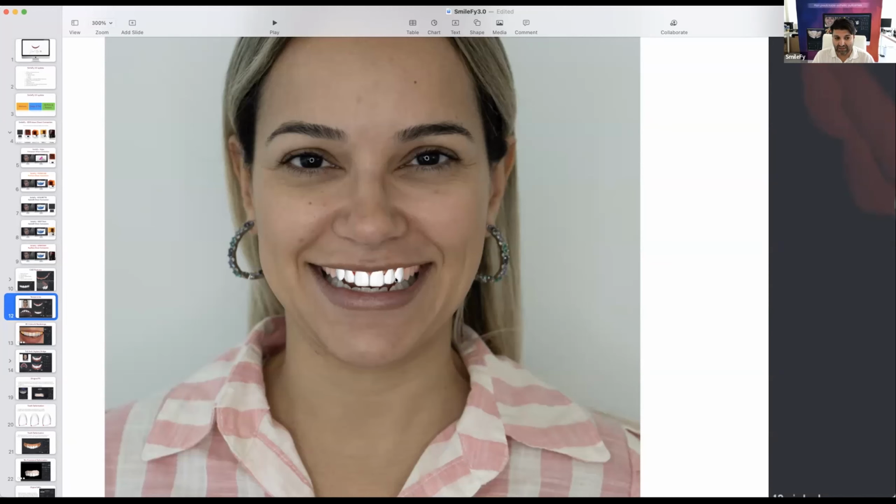So you see, we have the points. In the meantime, I already added opacity so that we can reduce opacity of the model, and then we see the points that are behind, because we have 3 rows of points, and then we deform the surface very, very easily. That's a real-time screen recording, right? So as you can see, it takes 15 seconds. And look at the quality of the design and look at the quality of the gingival margins.